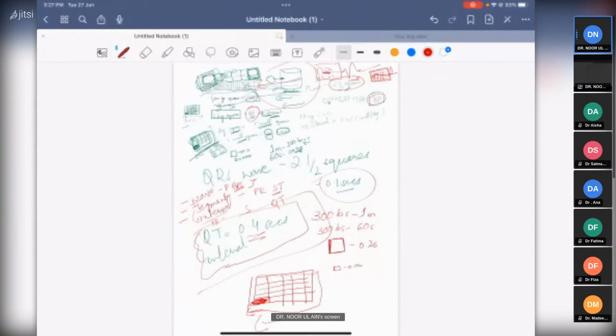So sometimes you will have a separate U wave. So it's very normal to see a U wave in normal individuals. It's because of papillary muscle contraction. When your papillary muscles are contracting, they produce a U wave, and it's abnormal in hypokalemia. Yes, but in normal cases maybe you will have a U wave, and the answer is still the same. It would still be 10 small boxes.